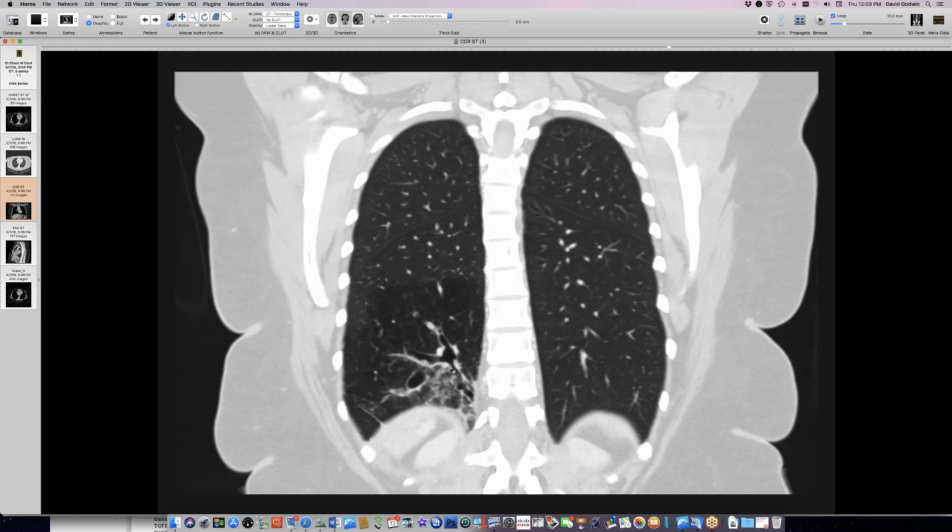So, you know, David, I was reviewing a paper. I was putting together a lecture on congenital anomalies, and there's a strong association, because some of this looks like it has CPAM components. You've got the sequestration with the supply, but it also looks like this is probably an area of bronchial atresia. There's frequently coexistence of all of these, and it kind of makes sense. The lung bud doesn't form normally, so you're left with the airway bits that aren't connected. You're left with the vascular bits that don't regress, and then you're left with the parenchymal, for lack of a better word, bits that don't develop normally.